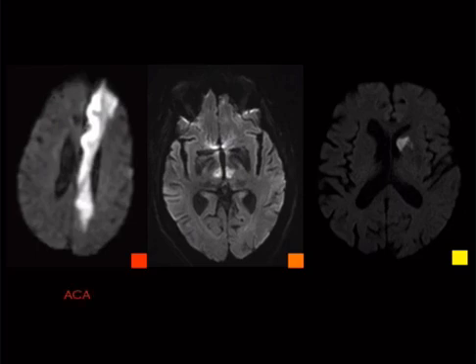The next one is a little stranger, right? Sort of bilateral thalamus, paramedian thalamus location. That is the artery of Percheron infarct. And this last one is another weird one that has a name to it. Right in the caudate head, that is the recurrent artery of Heubner.